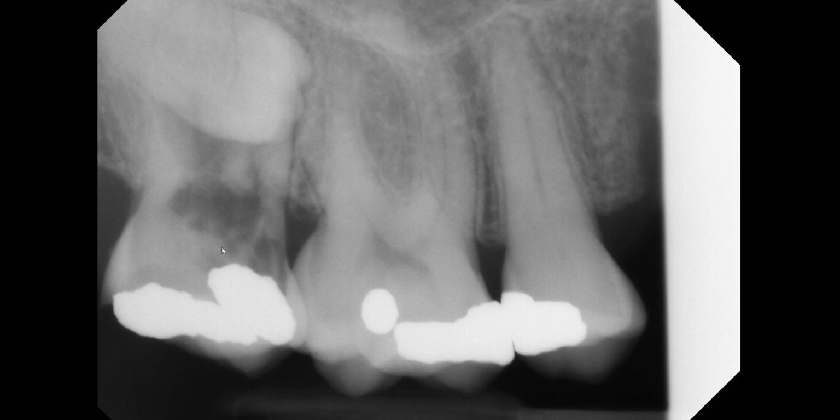Given the patient is having spontaneous pain at night, based on that clinical presentation alone, I would lean toward internal resorption, because external resorption can certainly cause spontaneous pain, which I have seen clinically. However, it's much less common. A patient with external resorption may be completely asymptomatic, and that is very frequently the case.